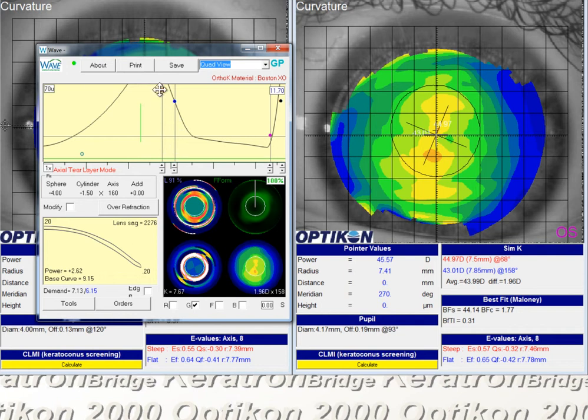The vertical placement of the red control point is not as critical at first because we're going to change it anyway. So we were originally, well, the power changed a little bit. Oh, that's because we were in 100% mode here. So what we need to do is move this back.